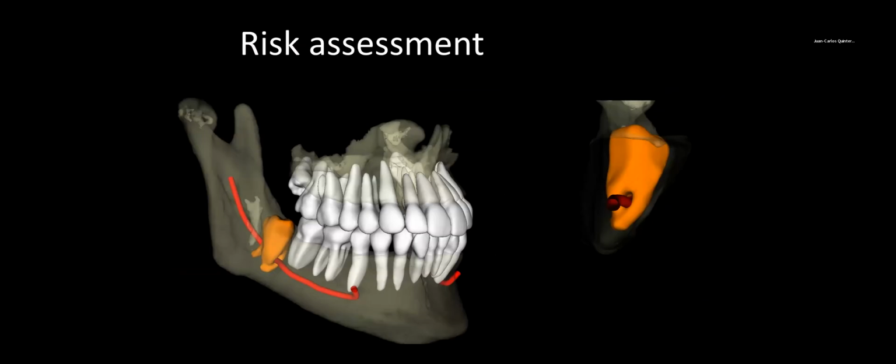Nerves, this is very important for the adult patients who never had their third molars removed. In our office, we are big fans of early removal or early enucleation of third molars when you think about the risks of a fully impacted, fully developed third molar in relationship to the nerve. There's a lot of unknowns on the 2D Panorex. So that's why the oral surgeons make you sign a boilerplate informed consent about a nerve injury.